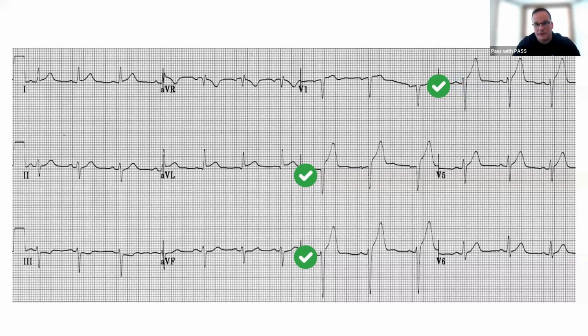It's my second anterior lead. I don't need it to say it's STEMI criteria. It's just showing me the severity of the STEMI. V5, like I said, it's hard for you all to see. I know certainly on projector screens, we're just under 1 millimeter of elevation in V5. So I don't have septal, anterior, and lateral leads involved yet, but I would certainly take another 12 lead in about 3 to 5 minutes.